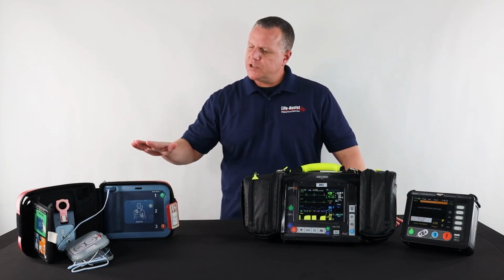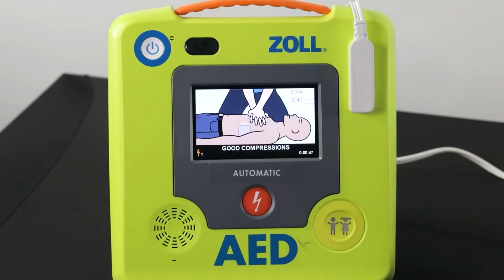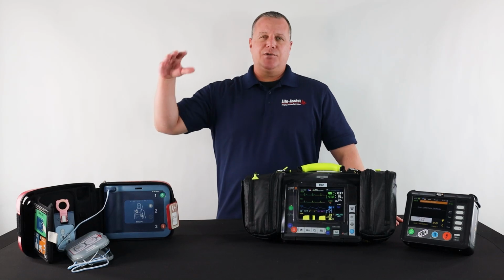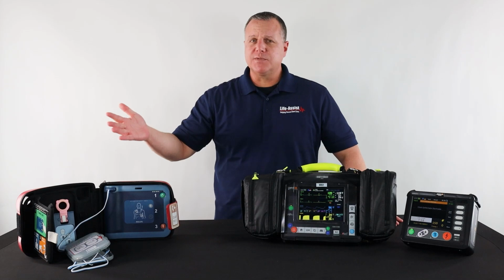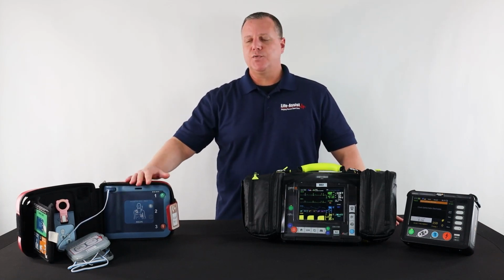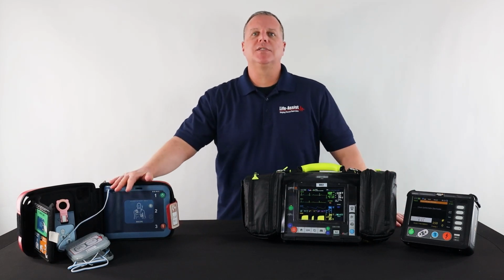Number one, it's got voice prompts. All AEDs are gonna have voice prompts. So it's gonna walk you through every single step of the way. Nowadays, you have options where not only voice, but others will have video prompts. So they'll have video displays. There's CPR feedback options where the pads are smart. They're called smart pads, and they can determine, if the person is performing CPR, whether they're pushing hard or fast enough. So it kind of coaches the person, in a situation where they possibly could be nervous.